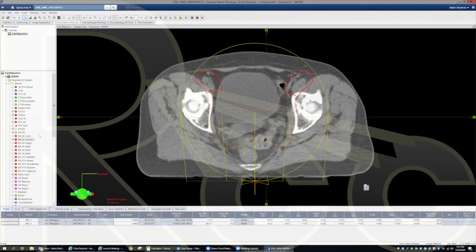And you only do these corners and edges on the lower PTV dose, correct? In this PTV-45. But for example, if you have weird shapes on the other, I'm thinking of a head and neck, you might need to do it on the other levels too, maybe. Yep. So sometimes in head and neck, I'll do it on, say, a PTV-54, and I'll also do it on a PTV-59, so wherever I see these corners, especially head and neck, you'll see it on multiple dose levels. I'll put those corners in. That's a good question.